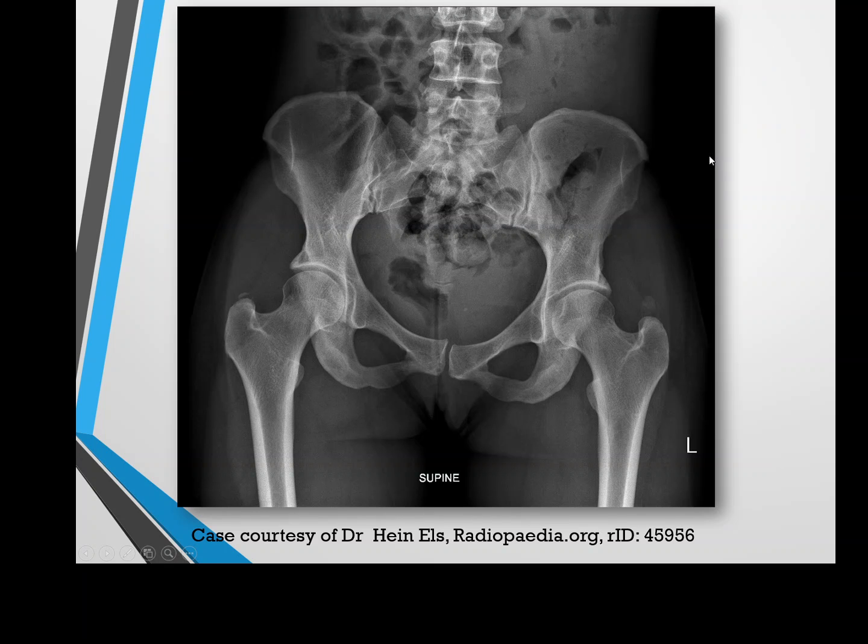And again, here we have a patient, in this particular patient, we have it bilaterally. Okay, so spine looks good, sacroiliac joints look good, symphysis pubis looks good. There's no sign of any soft tissue involvement as well around the glutes and things like this.